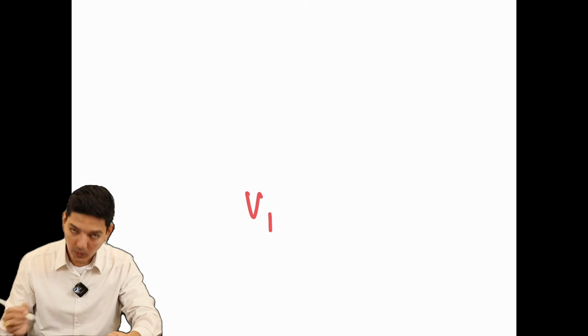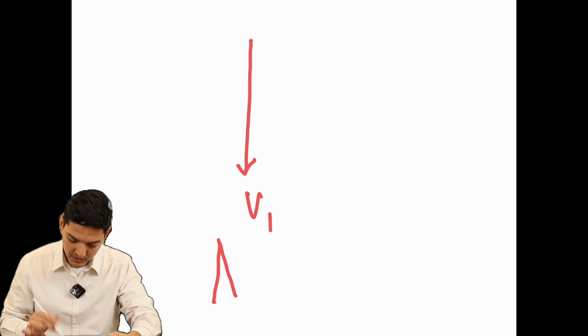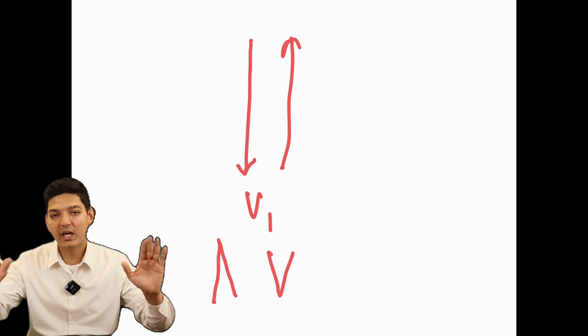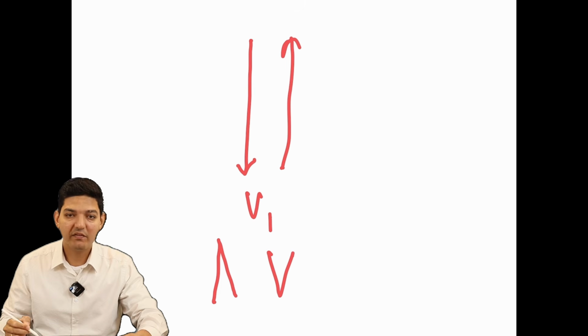Let's say there is a lead V1. Now if the depolarization is coming towards lead V1, it will give you a positive deflection. All right. If it is going away from V1, it will give you a negative deflection. Same thing applies to all the leads. And if the depolarization is moving perpendicular to the lead, then it will give you a biphasic wave.